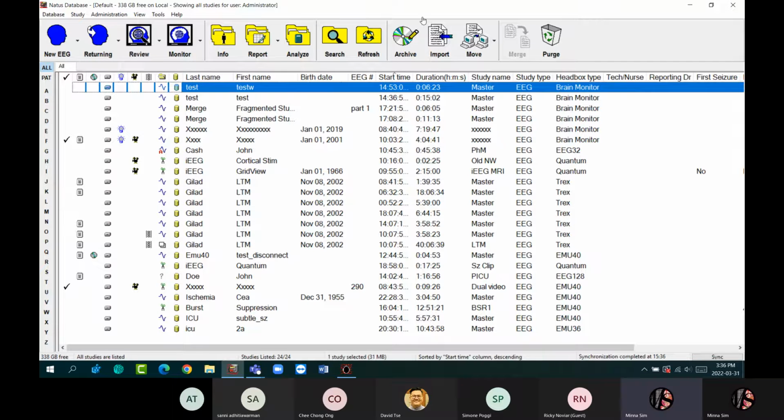Okay, can you see my screen? My latest database? Yes, Nina. Yes, we can see it clearly. Okay, good.